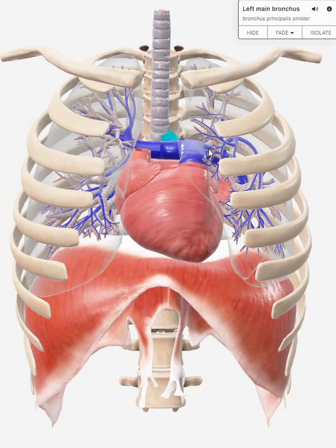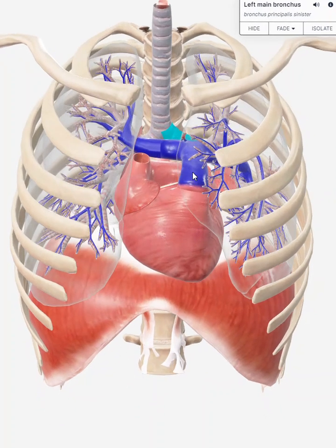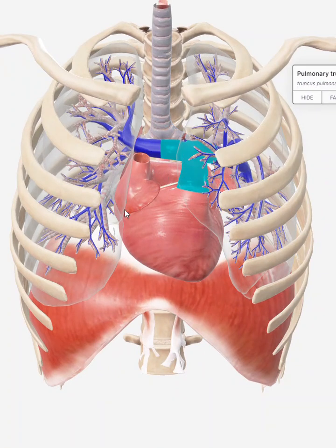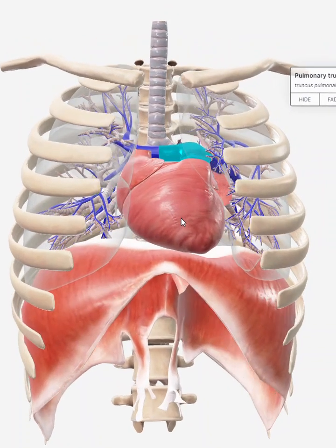Also the pulmonary trunk here. We'll be able to see the pulmonary trunk within the hilar region. They've labeled the right hilum and pulmonary artery all as one thing on that chest x-ray. We just need to know that we've penetrated through the heart, because you see how those things are behind the heart here.